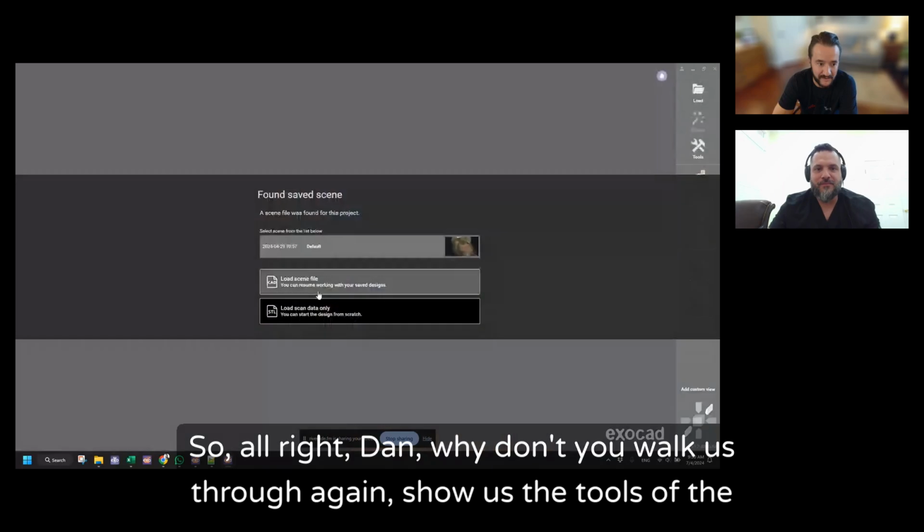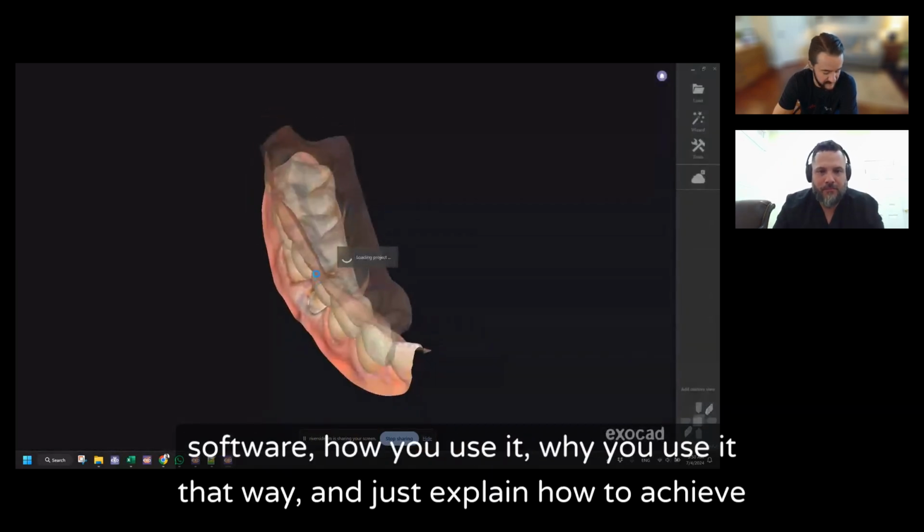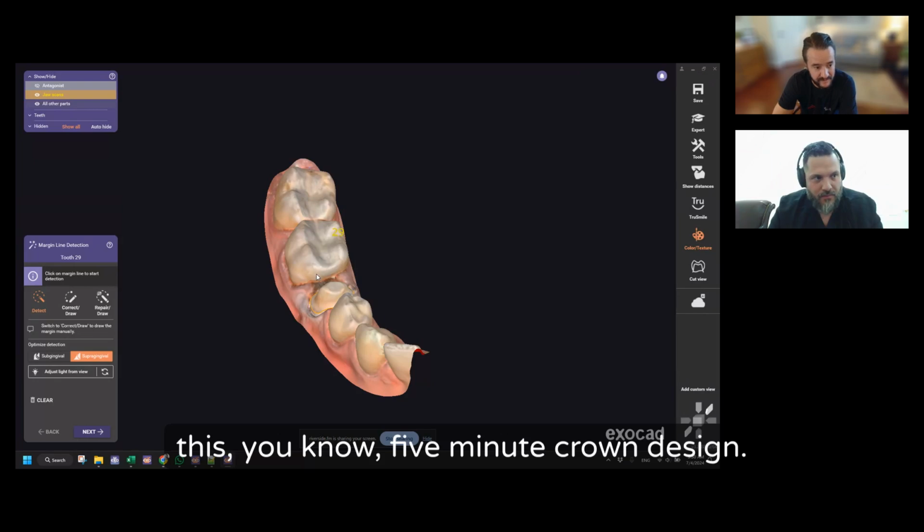So, all right, Daniel, why don't you walk us through again? Show us the tools of the software, how you use it, why you use it that way, and just explain how to achieve this 5 minute crown design.